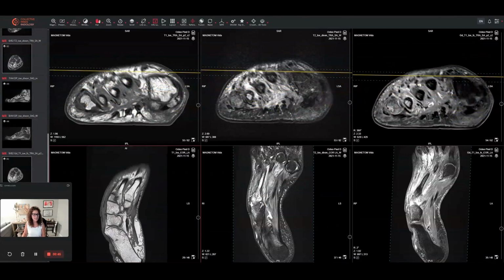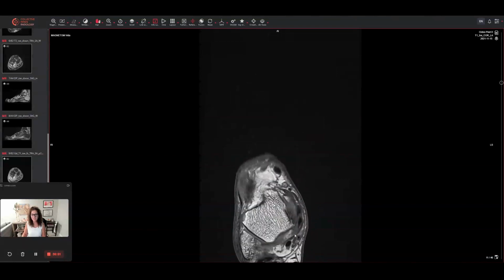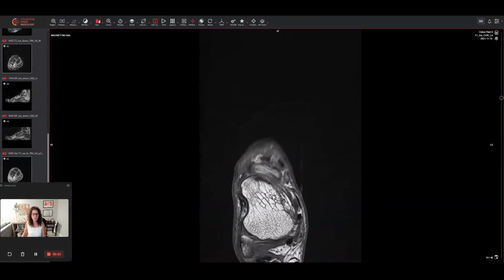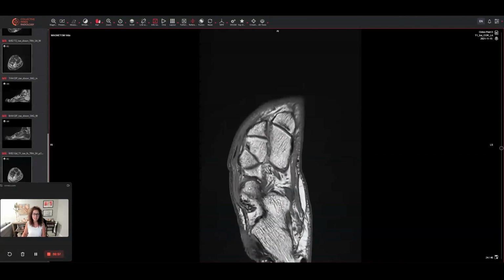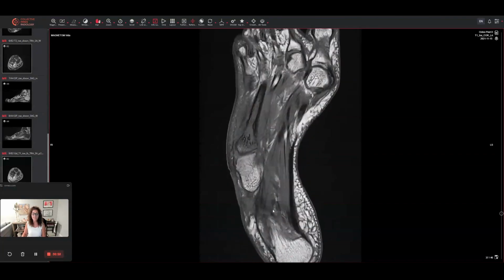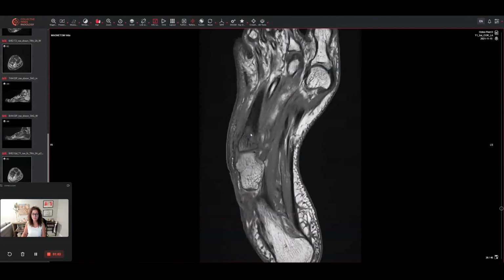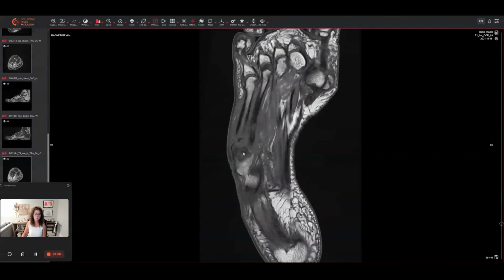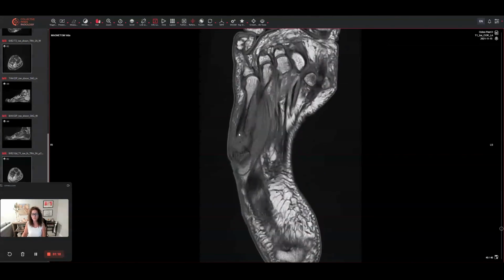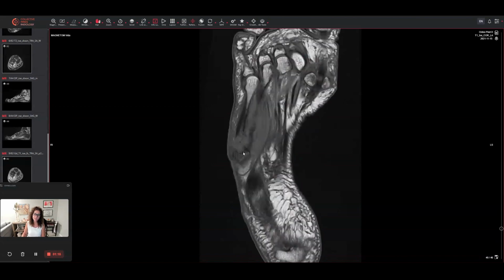What we're seeing in this diabetic foot essentially is, on the long axis T1 weighted images, we can see that the vector of the talus is performing this medial peritalar rotation in someone that has a severe rear foot varus, a compensatory metatarsus adductus, and that has placed their lateral foot into a supinated position, and they're effectively destroying their fifth metatarsal base that has been infiltrated by this T1 replacement.